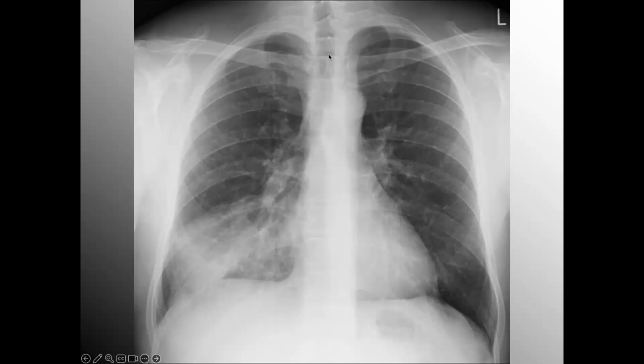Fairly midline is the airway, maybe slightly offset towards the right, ever so slightly, so do keep that in mind. I don't see adenopathy, although there are some prominent lymph nodes here. You might get a radiologist or two that may say they have mild lymphadenopathy. B, bones: there's no breaks, fractures, fissures. You would typically know if you're suspecting there to be some type of bone abnormality, but stranger things have happened.